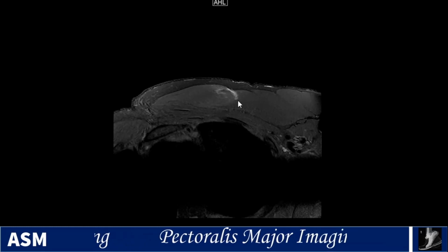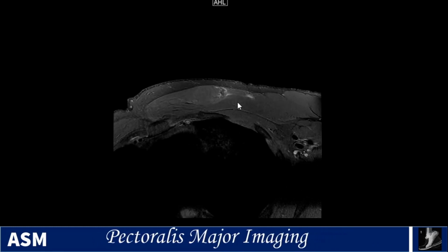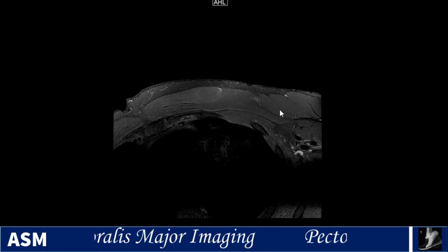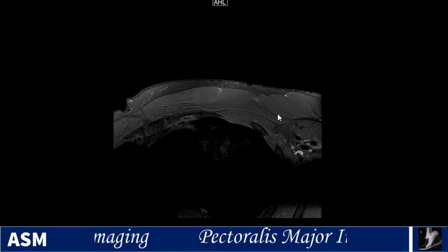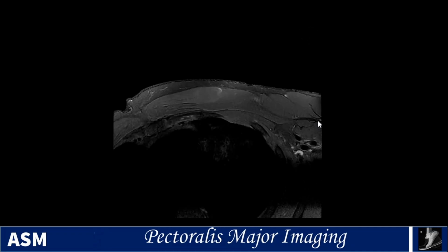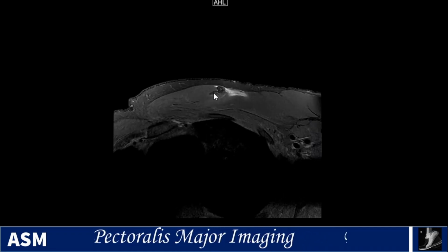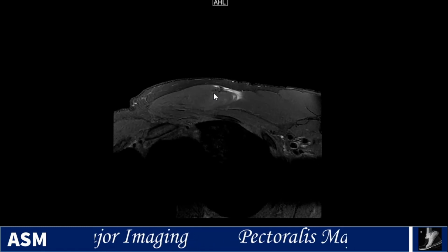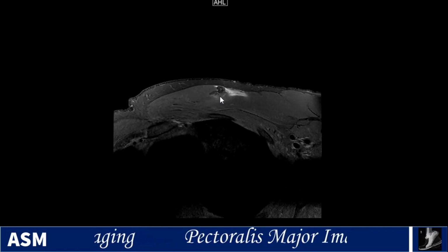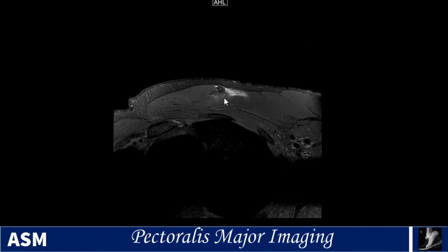This was something that could potentially not be repaired because it's really not at the tendon where they typically do surgery. So here's your tendon here. You can see that that is intact, and this is an intramuscular, tendon-less injury, so intramuscular. This would be a strain.